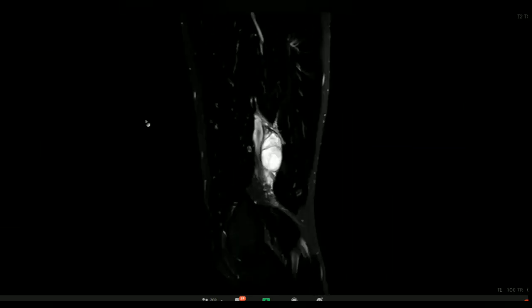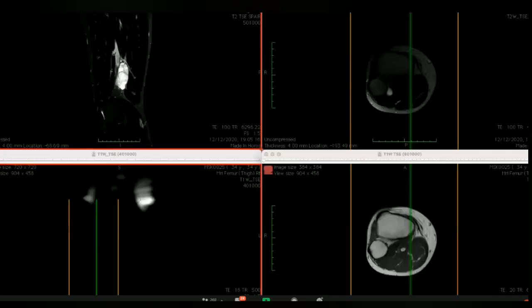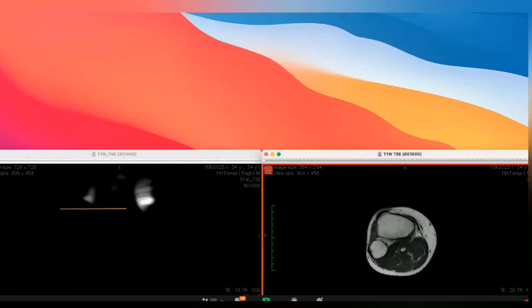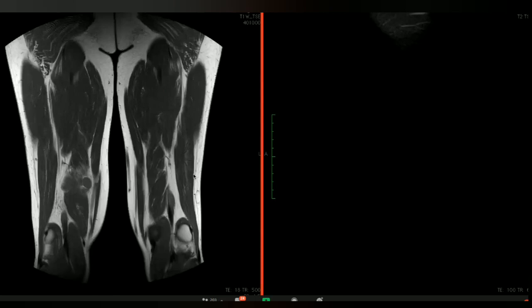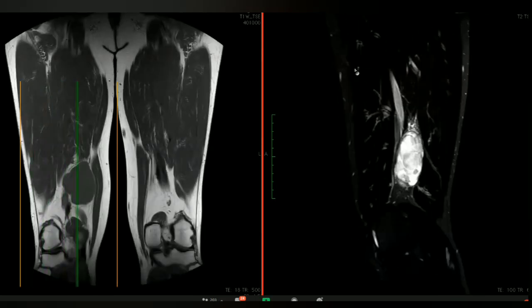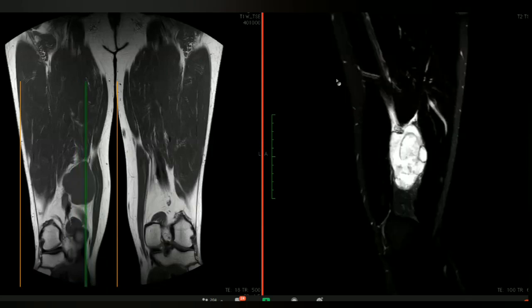Well, I've given you a hint, isn't it? I've put the MRI scan for you. I've got 4 sequences for you. I'm going to try and make the screen a little bit smaller, but put more sequences on. And there's a very important learning point here, and from the perspective of those practicing in Pakistan, this is very, very important. What I'm going to say might upset even a few people, but that's not the point. Tell me what you see on this.